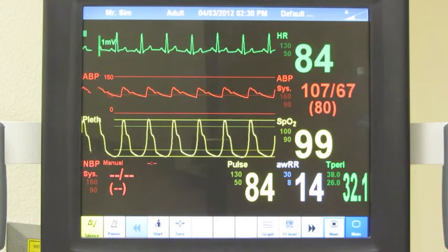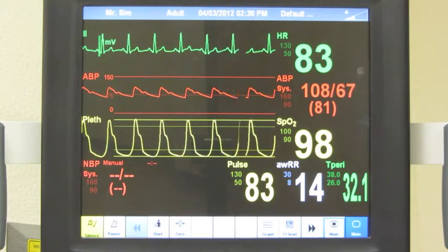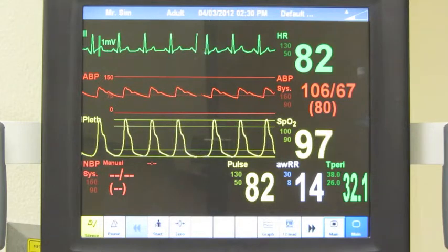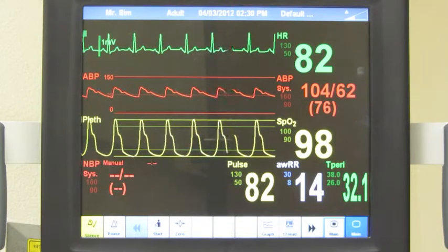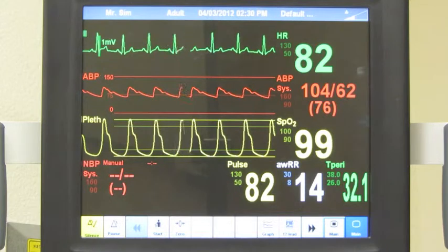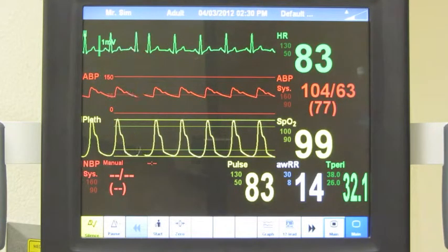In addition, you'll notice a line for blood pressure, currently set at about 108/66 millimeters of mercury pressure. Once again, both of these variables will vary slightly over the time course. That's normal variation. The third line is the oximeter reading for oxygen saturation.